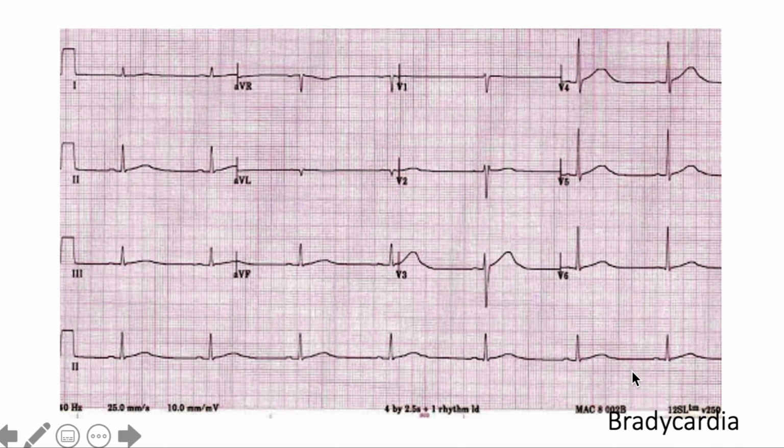That's going to be considered bradycardia, and in fact, severe bradycardia, and likely it's coming from an origin that's below the atria.